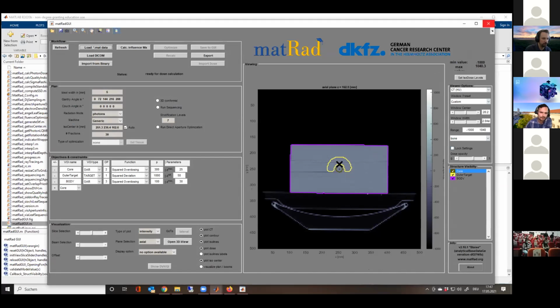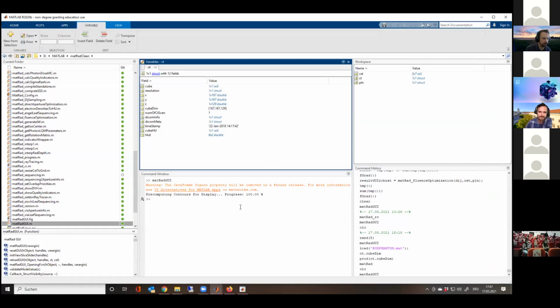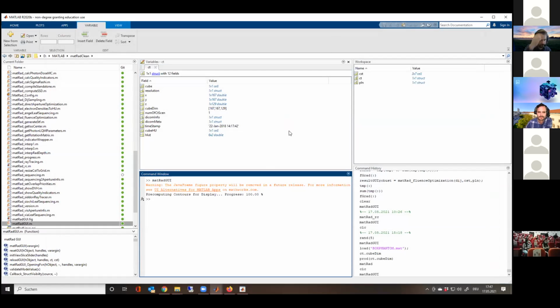Sanjib, and you do have a MATLAB installation, right? Yes, I have. Okay, perfect. I have done this, but I'm just asking, is this the process or anything else? That's the main process.